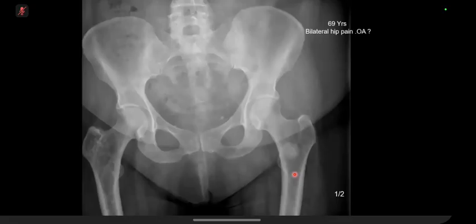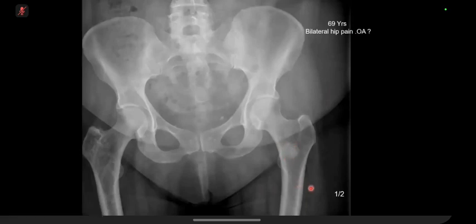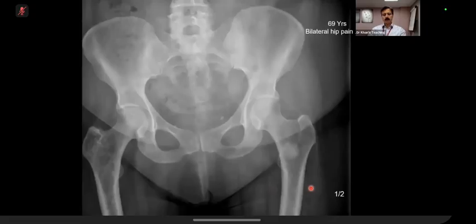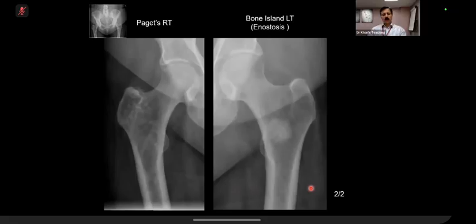So it looks like there's a lucency around. So we are talking about, where yeah. This margin, how is this margin? Anything comes to your mind? No. Okay, I'll take over.